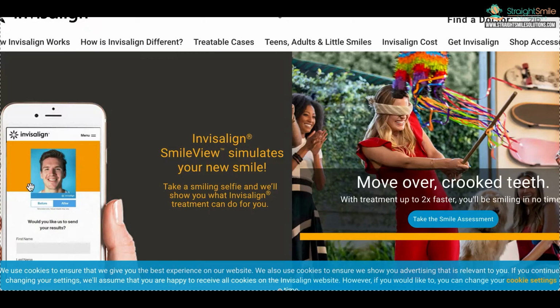I see that as a major drawback already, that in order to have your patients be part of this virtual care, which is a benefit, they have to download an app, accept the terms and conditions, and put in their personal information in order to download the app, okay? Then you have to put in their personal information within the dashboard.